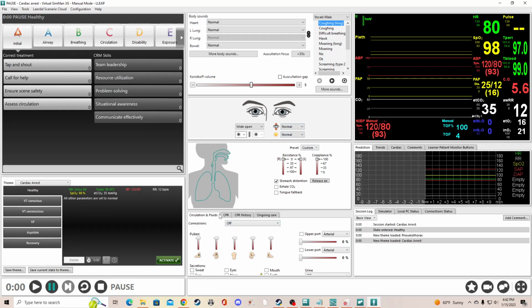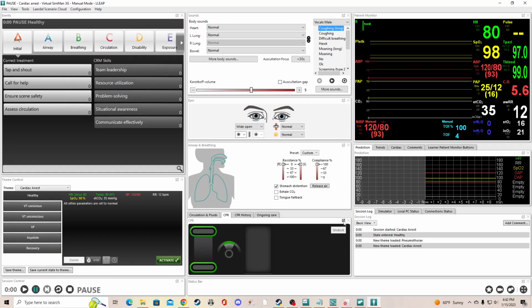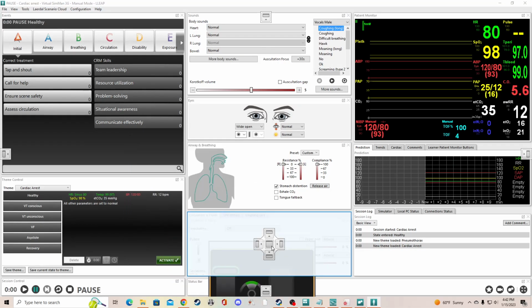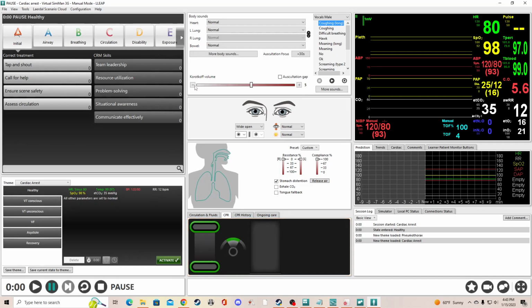So if there's any button that you keep going to, and you're like, I really want to be able to see this, you can just hit F3 and you could say straight up just undock, or you can find another home for it. So we're going to put it right back in. I think we can even order. We can drag and drop and do the orders. So just quick, how to customize all this. I think it's important to talk about.